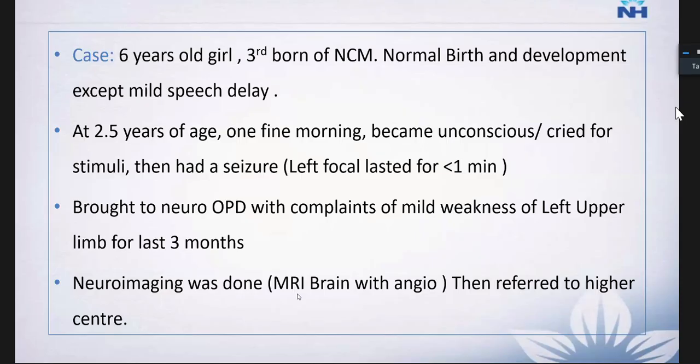Somebody mentioned hypomyelination versus leukodystrophy. Hypomyelination comes under the spectrum of white matter disease, and usually hypomyelination is primary or secondary. The primary hypomyelination affects the entire brain parenchyma, involving the cerebrum as well as cerebellum in most of the cases, and you will see slightly hyperintense white matter on T2 weighted and FLAIR images, and T1 isointensity or slightly hypointensity in that kind of scenario.